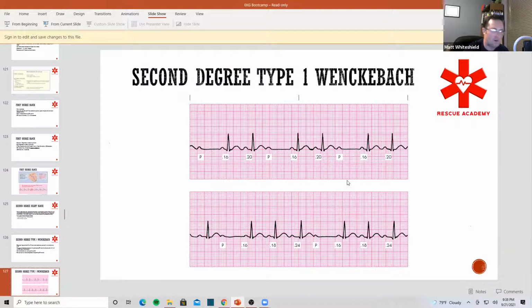Going, gone. All right, let's take a look at this one down here. We get a P wave here. This one looks normal. Right here, still looks normal, but it's one block or almost one block greater than this one. Over here, it's even more delayed, and then we have a dropped beat. Going, gone. Changes in the PRI.